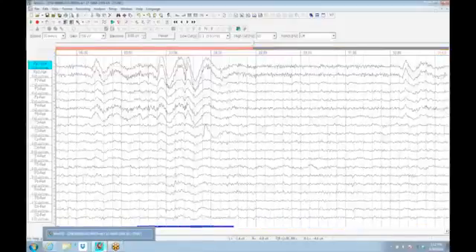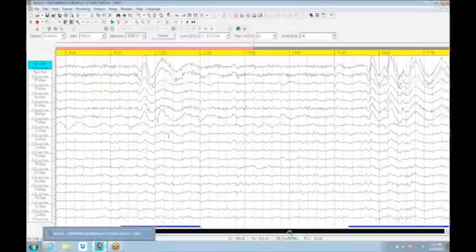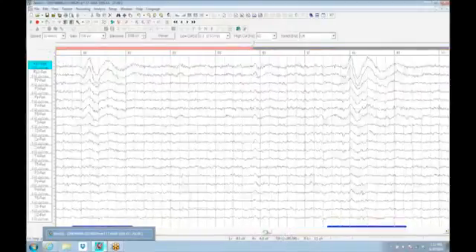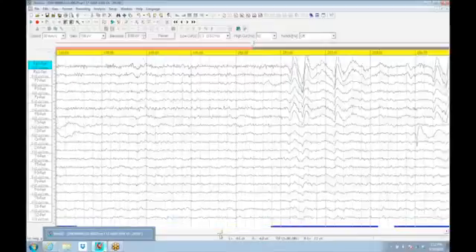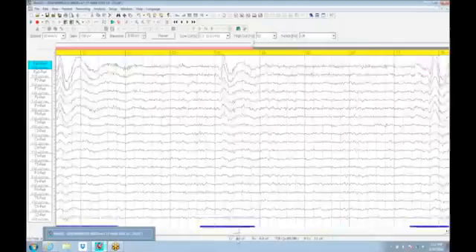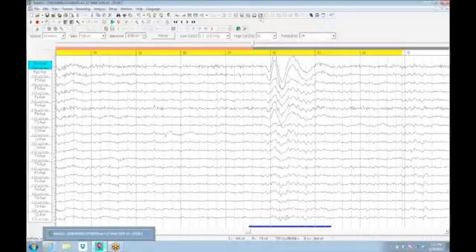of this EEG. I'm going to go from the beginning of the EEG to a few hundred seconds into the EEG. We ended up with a change in probably eyes or something. There's a change in the mark. Anyway, I've got a big chunk of EEG selected, and I'm going to click on this. This now lights up now that I have a piece of EEG selected. And this is an artifact correction algorithm.